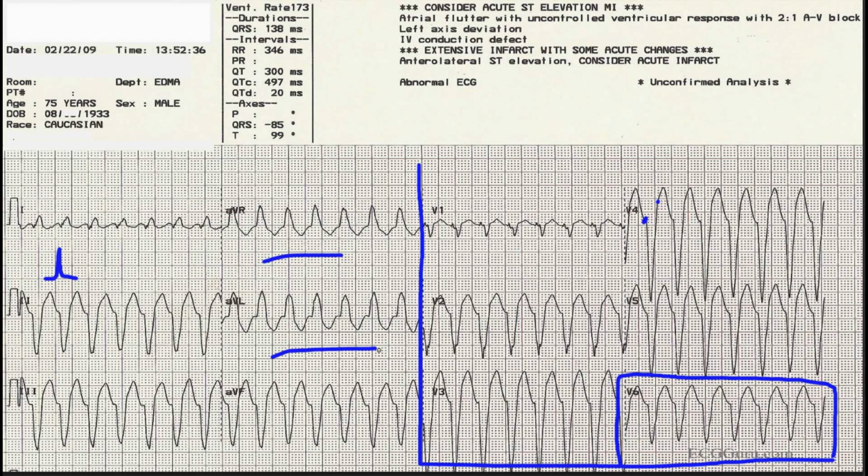And AVL is positive. So as long as we've checked our electrodes and we know we put the right arm electrode on the right arm and the left arm electrode on the left arm, then the only conclusion we can draw here is that this impulse started near the bottom of the heart and is traveling backward. It's traveling toward AVR, toward AVL, and away from the foot leads 2, 3, and AVF. So that backward direction, or backward axis, is very strongly suggestive of VTach.